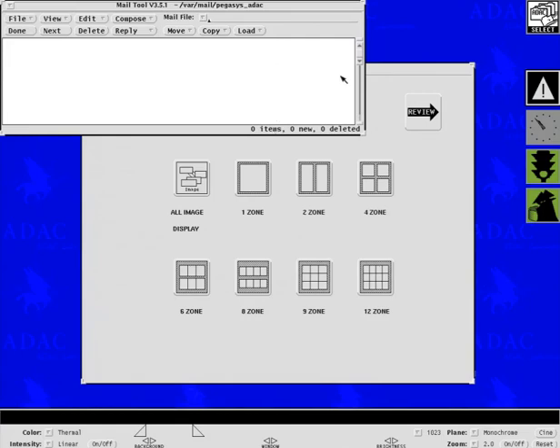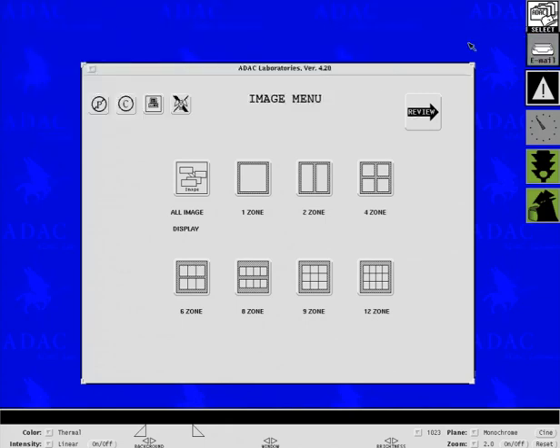Most of the time, they're just junk messages. You don't want to let this get full. You don't want to let this get very populated. The best way to deal with it is when there's items in here, just click on delete and delete them. Once you've deleted them all, right-click on File, Save Changes. Then you can quit this window or close this window. I'm going to close it.